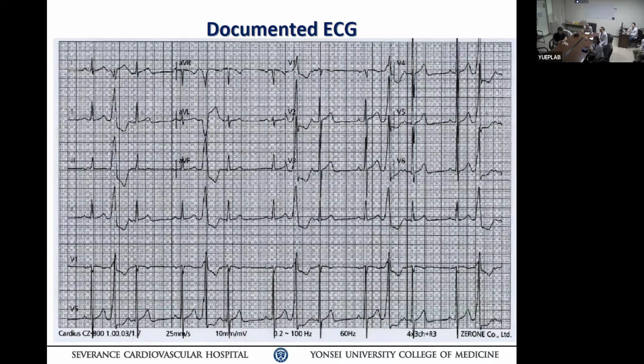Okay. The P wave, the preceding P wave with sinus speed. Point that arrow at the first P you measured. Do you have an arrow there? No, before that one. The first one coming before the PVC. Okay, that first P just before, that's not a P. Come down to the rhythm strip, P1, P2. Yeah, that one, that's P. And then you have a PVC following the P wave, right? The next one coming down, yeah, that one, and then the following one.